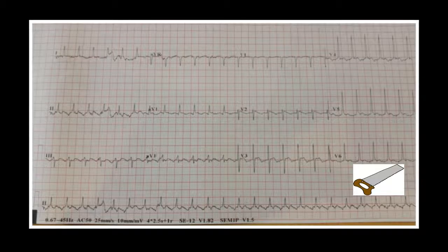Now, there's a couple of nuances with atrial flutter. The first thing is that when you're trying to form a general impression, you can characteristically see this typical sawtooth pattern. And if you ever look at lead 2, especially from far, you can kind of pick up a sawtooth pattern. The next thing to remember is that if you have a heart rate of 150 plus or minus 20, you must think atrial flutter with a 2-to-1 conduction.